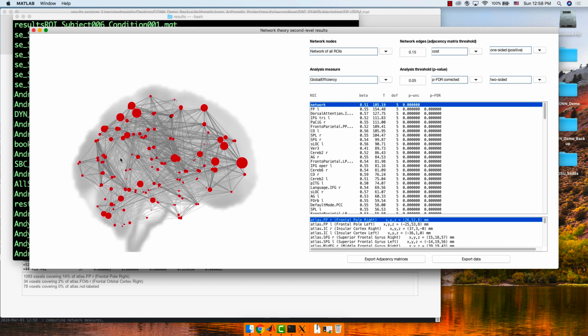By default, it's going to give you a network of all the possible ROIs, right? The only threshold, and that's at the very top here, this is cost, right? So let me try to remember how this is structured exactly. If you wanted something like, say, correlation coefficient, you're only going to look at edges that pass a certain threshold. As you decrease this number, let's say press enter, just wait for it to update.